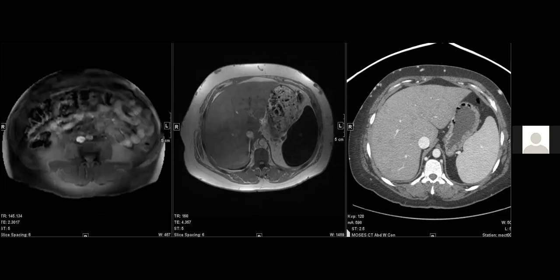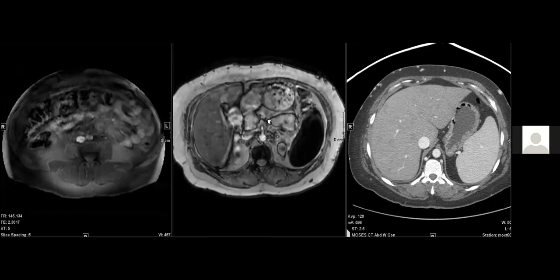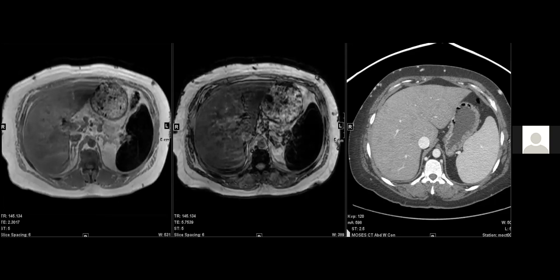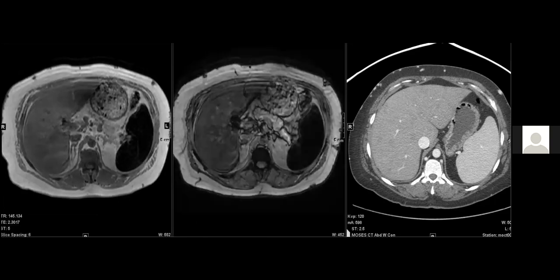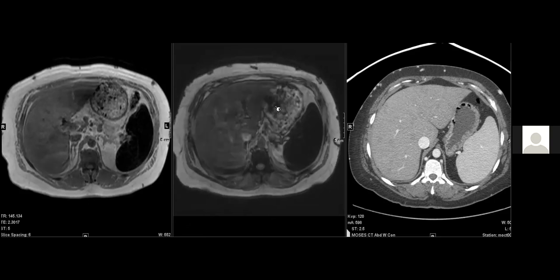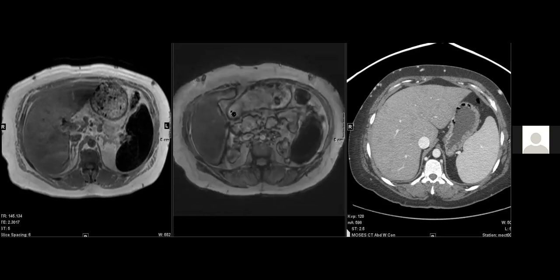When we use the 3 Tesla scanner, the spleen was already very dark, but you can see that it was darker on the out of phase, which was the second echo. So again, iron doesn't drop on in phase or out of phase. Iron drops on the second echo.